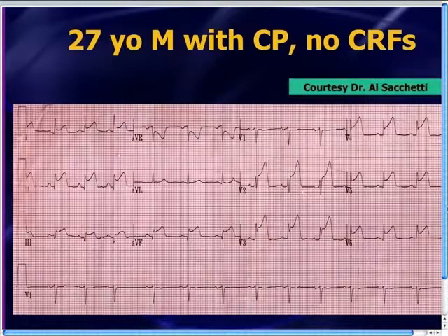I went through my files and I couldn't find where I had read this, but it is something that's probably worth remembering. It's popped up in clinical practice, and once again, it does pop up here as well. Take a look at lead V4. In fact, take a look at the merging of the QRS complex with the T wave. One of the things you'll notice is there pretty much is no ST segment at all. Essentially, you go from the QR and then suddenly you go right off into the T wave.